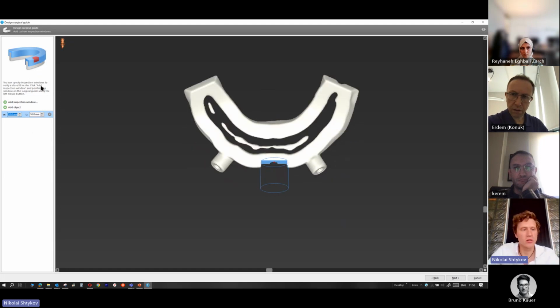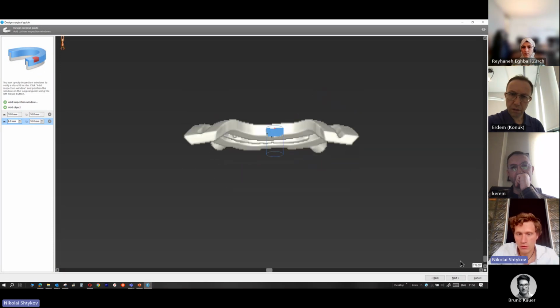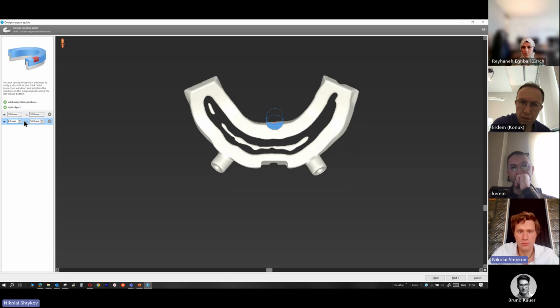Also, you can add some points, retention points. I think it's okay.